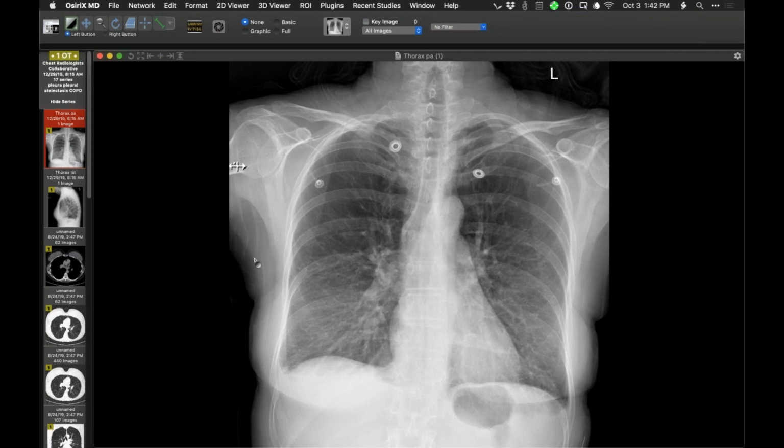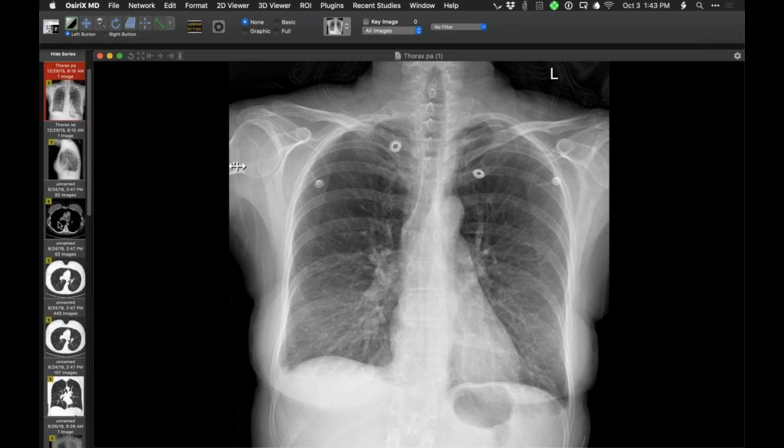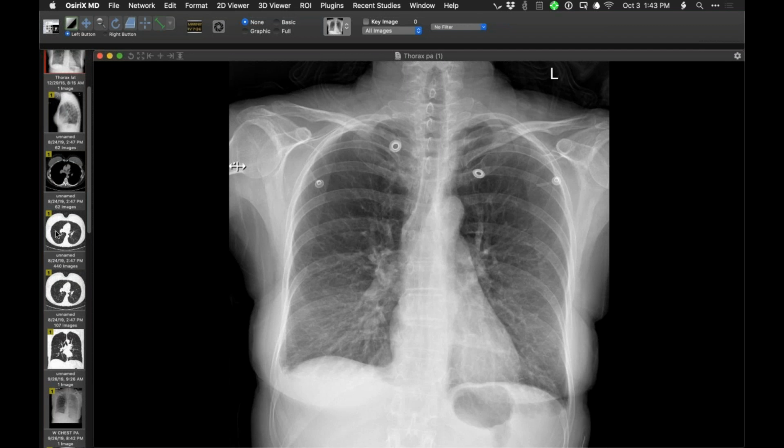Now, that can be done surgically, as you know, in selected candidates who meet the criteria for lung volume reduction surgery. And one of the criteria is a very heterogeneous distribution of pulmonary emphysema in the upper lobes typically compared to the lower lung zones. But they can also do this medically now. By means of endobronchial valves, one can do a transbronchoscopic medical form of lung volume reduction surgery. And I don't know exactly why, but she did end up going to the pulmonary physicians, not the surgeon, and they deemed that she was a candidate for that, so they did the procedure.